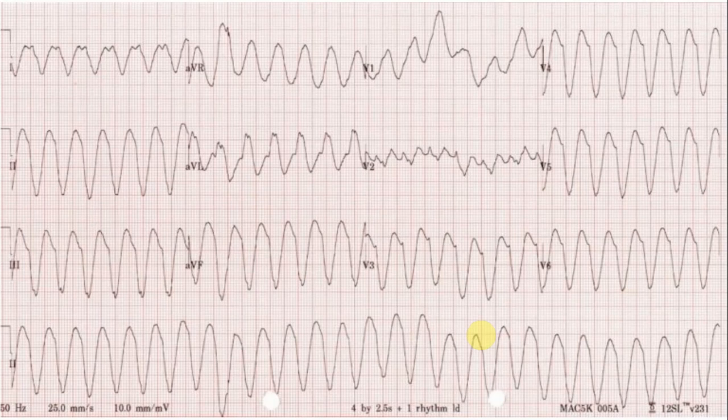I've got a different video where I have explained all those different steps. So every time you look at the ECG, go through this in a systematic way, just like what Becky has done. So the specific finding in this ECG is that Brugada criterion 1 is present, which means we cannot identify any R wave, we cannot identify any S wave. If you call this one an S wave, then where is the R wave? If you call this an R wave, where is the S wave?